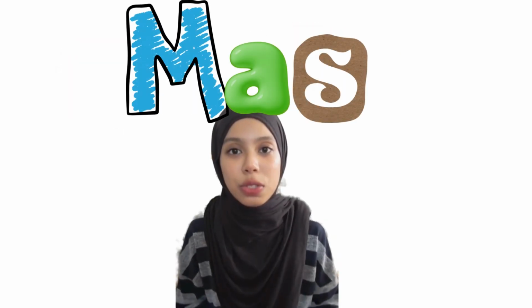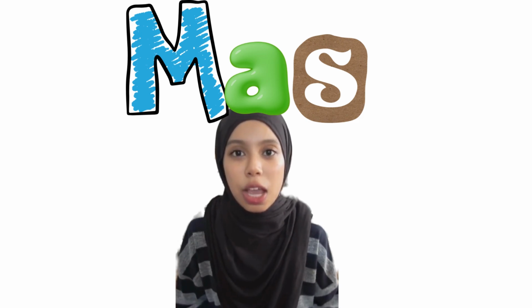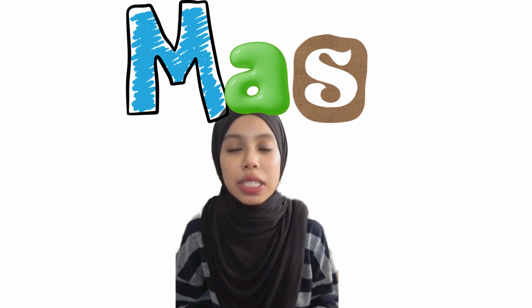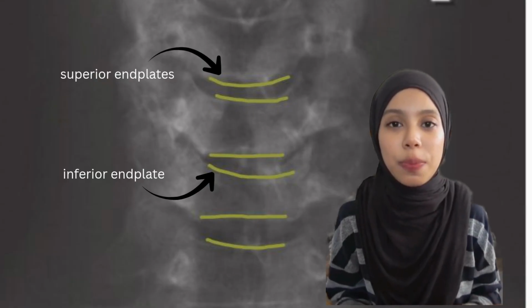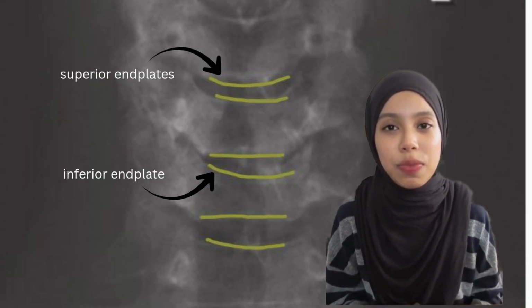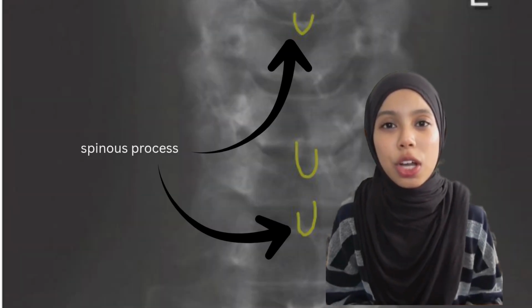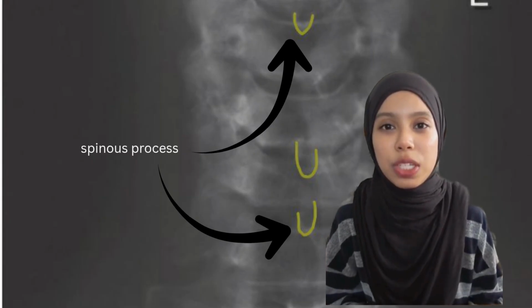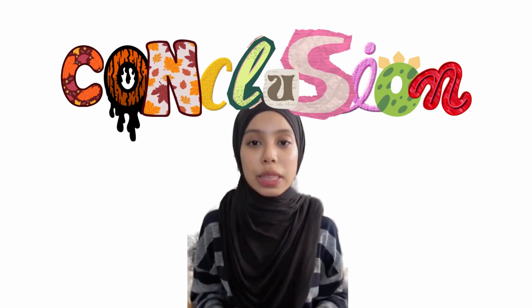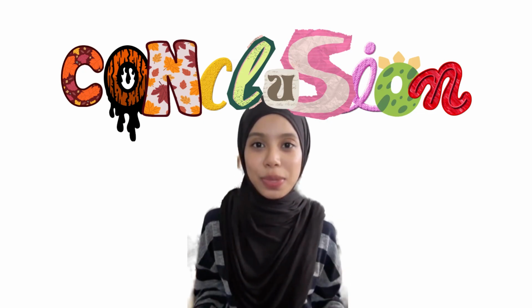The mAs used is 16 mAs for detail and density. This is because the thin structure of the bony trabecular pattern, which is the superior and inferior end plates, can be visualized, and also the thick structure of the bony trabecular pattern, which is the spinous process, can also be visualized. This indicates that the density is adequate. Therefore, no change in kVp and mAs.